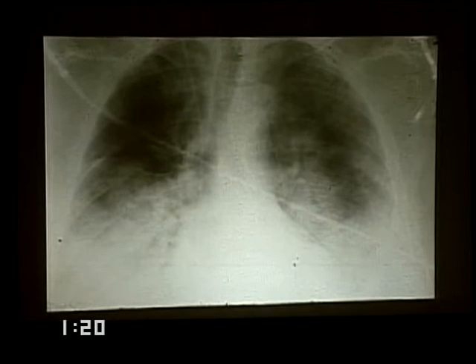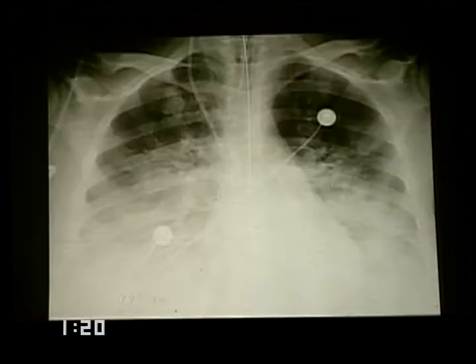When there is diffuse opacification in the bases, the etiology becomes very elusive, and one has to have a well-developed differential diagnosis. These two diseases are extraordinarily similar in appearance. One of them, on this side, is aspiration.